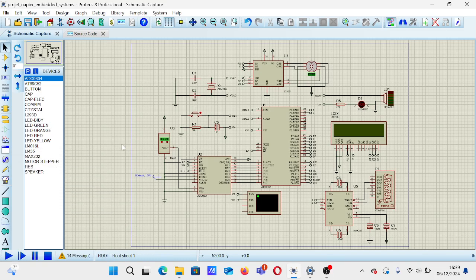Hi everyone, welcome to the demonstration of my embedded system project on the air warming medical device. In this video, I will first introduce all the components used, along with a brief description of each one, and then move on to the practical phase with several tests.